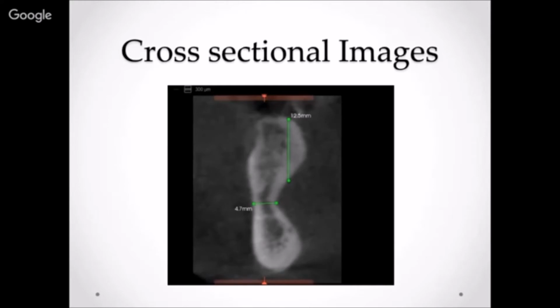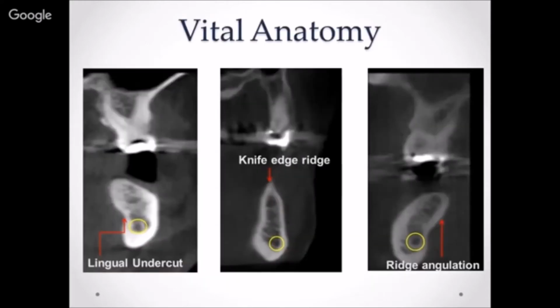So not limited to... But at least when we look at an implant site, if I were to pick 3 things to keep in mind every single time when you assess an implant site, I would probably have these 3 things to look for in my mind. So the yellow component, of course, the yellow mark over there, circles indicate the inferior nerve canal.